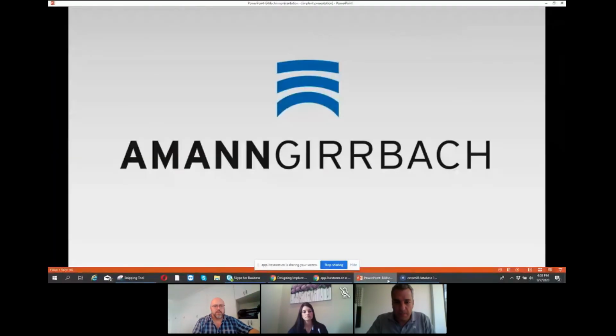About the webinar of today, it will be about implant software and implant design. It will be divided in two parts. The first part will be a presentation about implants. I'll try to make it a little bit short, and then we will go into the software to do all the steps. So I will share my screen here.